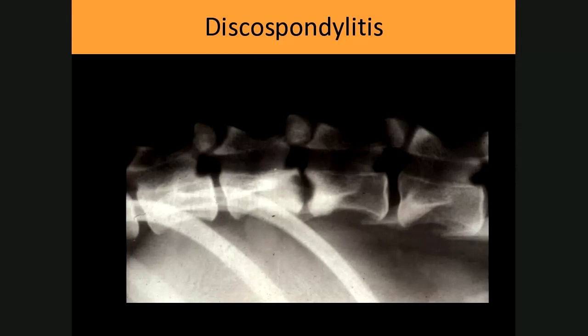So if you take a few seconds to look at this image, and you can hit pause if you want to, then you can just describe the findings radiologically to get an idea of how we would describe this lesion.